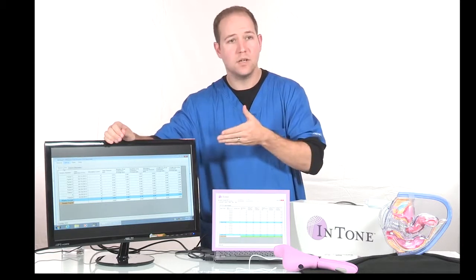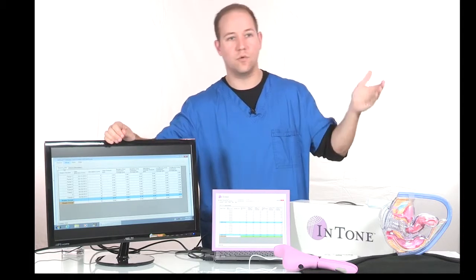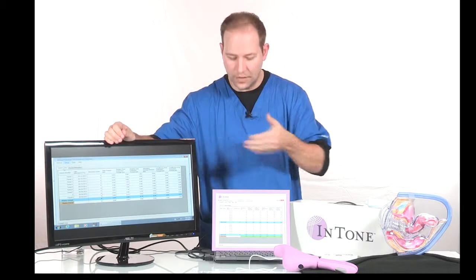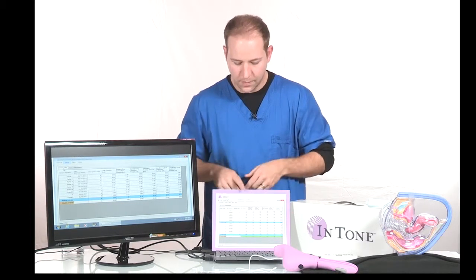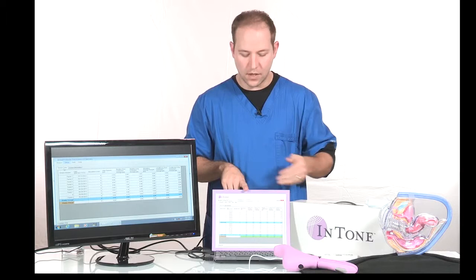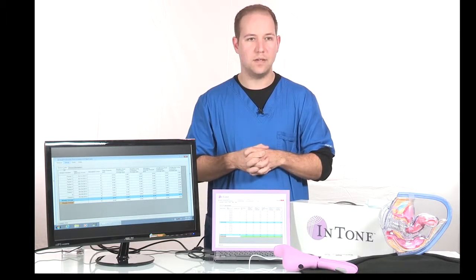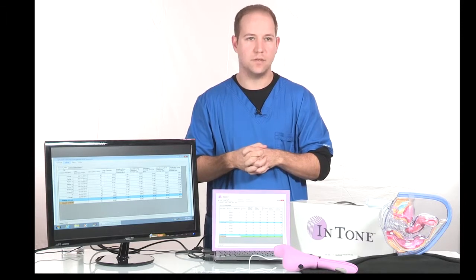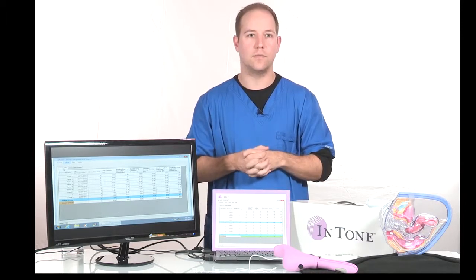So if the patient has pumped it up to a 5 one day and a 10 the next and a 7 the next and a 14 the next, the data will not look as it does here. In this particular case, the patient pumped their device up to their comfortably snug to the same level each day. Thus, when it averaged out all the pressures, it could measure the baseline pressures changing in a positive direction, showing that the pelvic floor has strengthened off of the baseline.